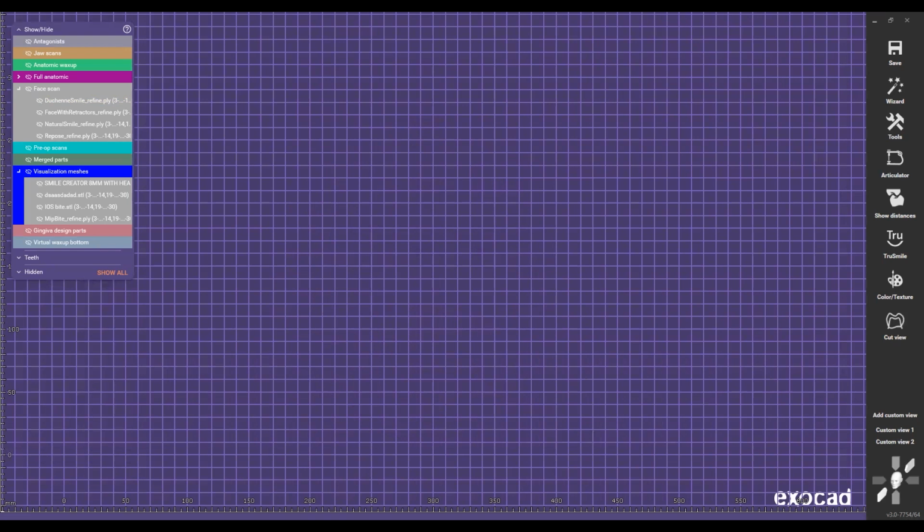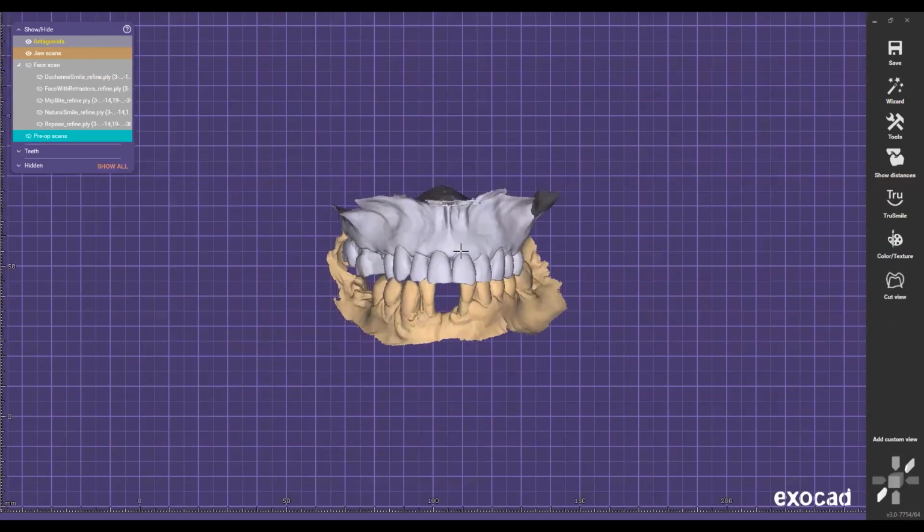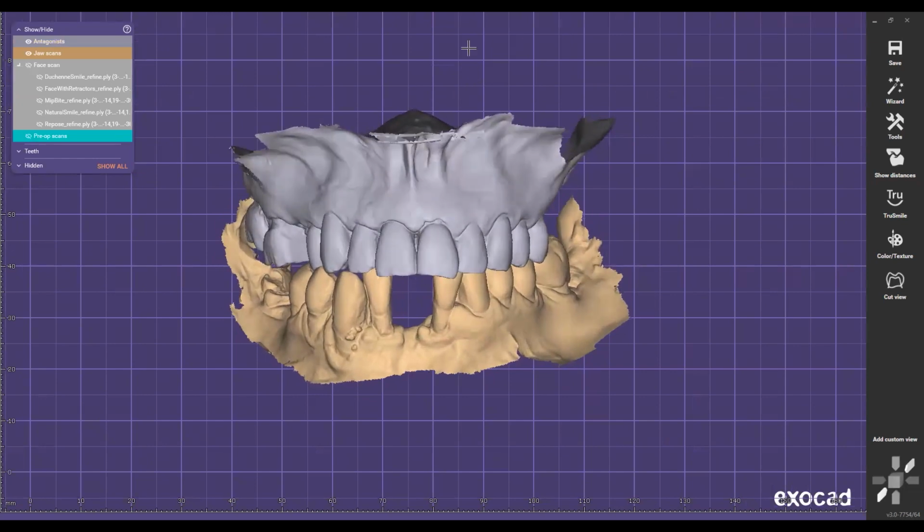So one thing I like to do is... Basar, let me know if you can see this, upper and lower jaws right now. Are you able to see that? Otherwise I can stop. Let me see if I can share. Let me share this one right here. So are you able to see the upper and lower models? Let me see. Okay, clear now.